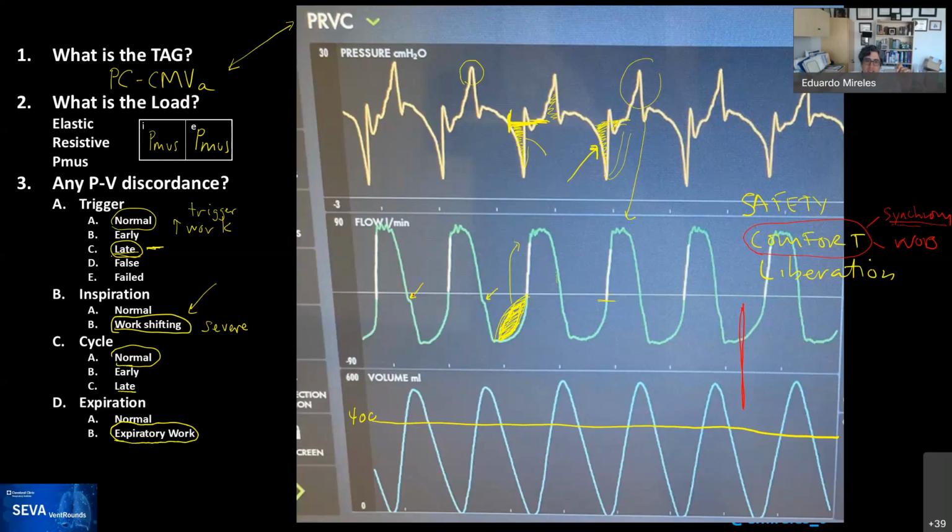So this late cycle that is over here would disappear in a sense if you had him on pressure support, as you're mentioning. And the second one is this work of breathing relationship that you're bringing up. Right now, this is P vent, the pressure delivered by the ventilator, and the pressure from the patient. If you're talking about the pressure right now with PRVC, the pressure goes down, and actually this patient is crossing down here. It's almost not getting anything. So this is the PC-CMV.